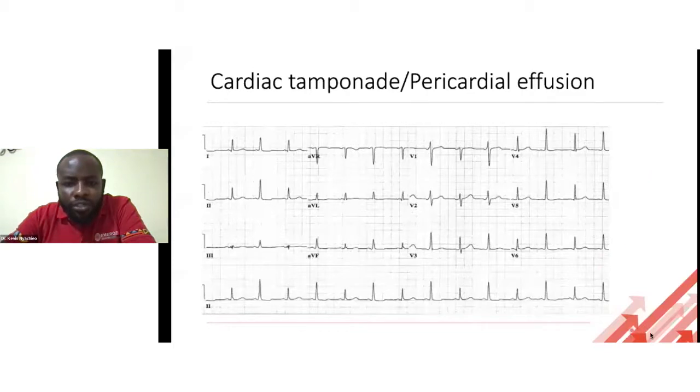We'll be able to point out Brugada syndrome, the delta wave, and all those other ECGs, including ECGs of hypokalemia, all of those electrolyte imbalances, and what I've not talked about here.